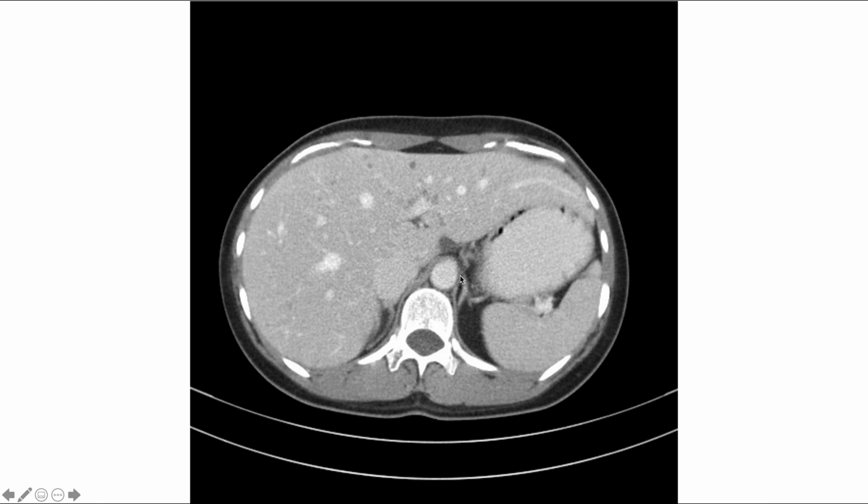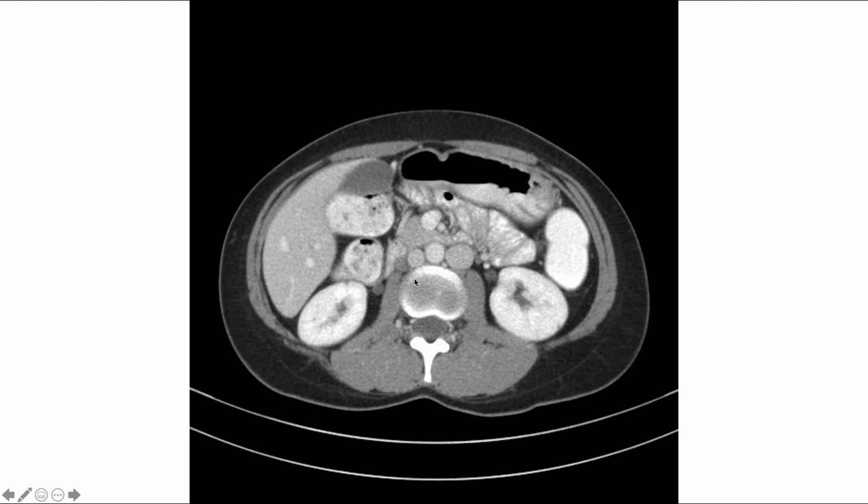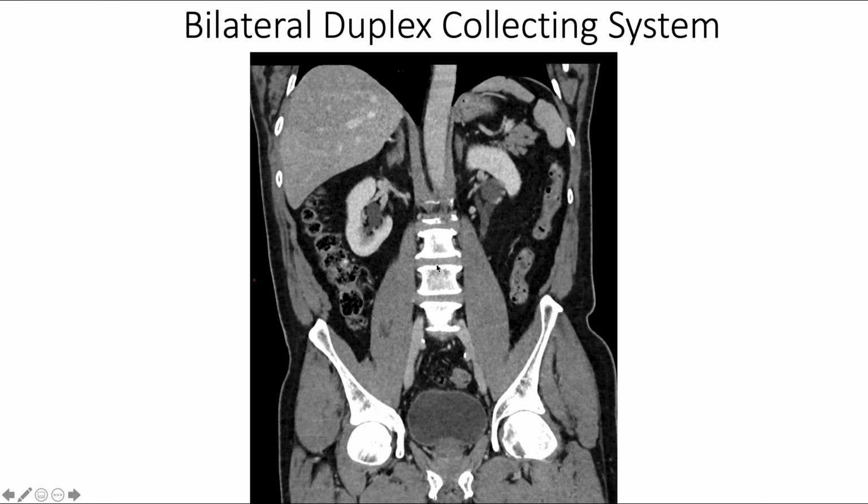And then a similar idea in the axial view. So here's the interface of the inferior vena cava into the liver. And then as we descend, we can clearly see the widening of the inferior vena cava and then its eventual bifurcation into the left and right inferior vena cavae, as well as the abdominal aorta sandwiched in between.